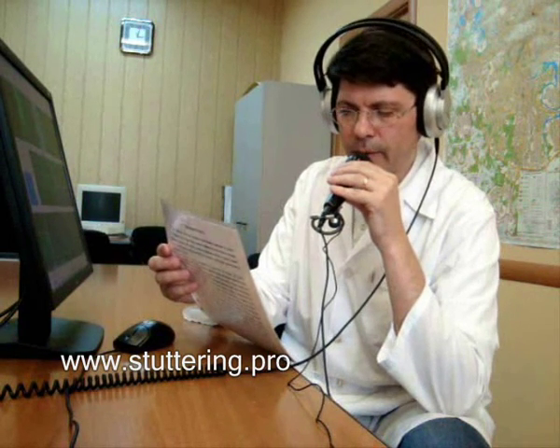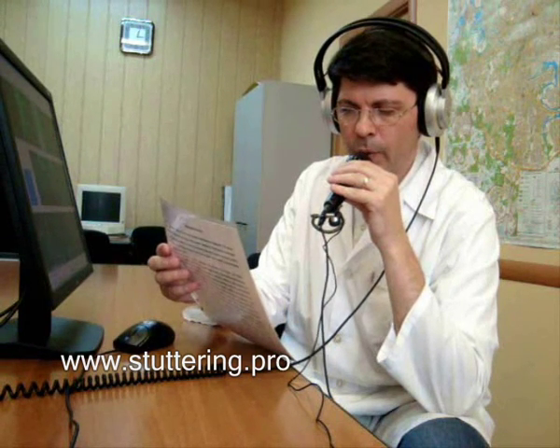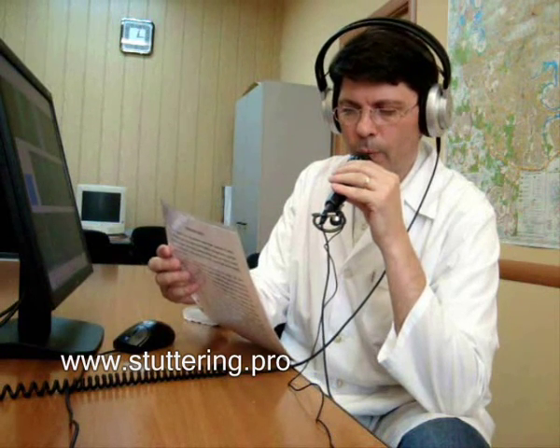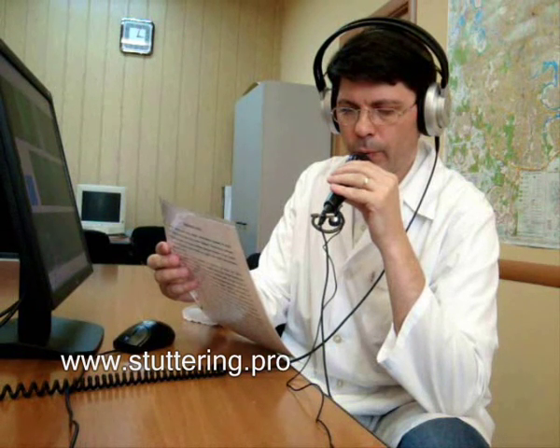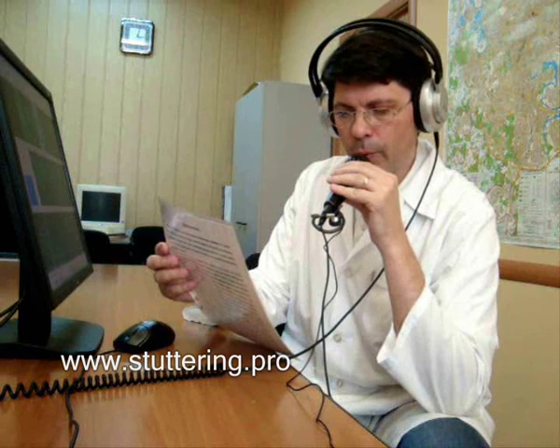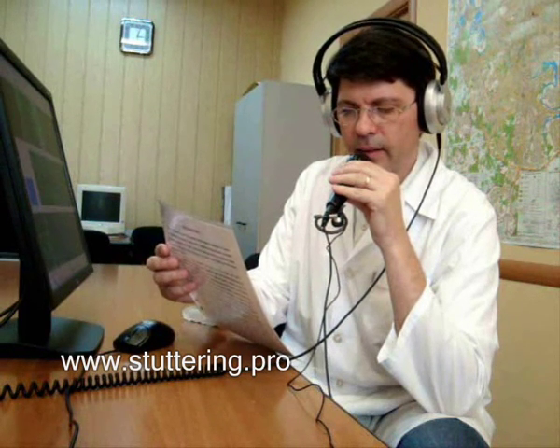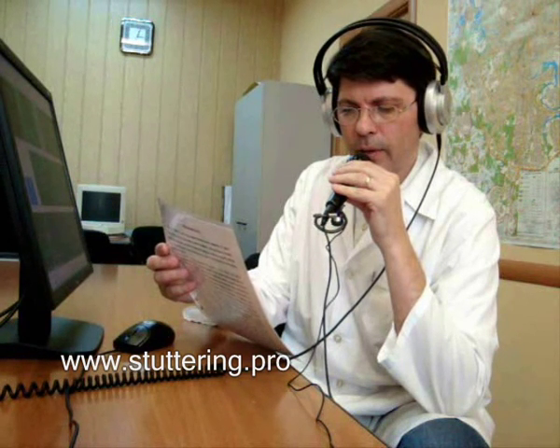Second, it lowers the pitch of the voice, which in its turn relaxes our vocal cords. It's called frequency shift auditory feedback.